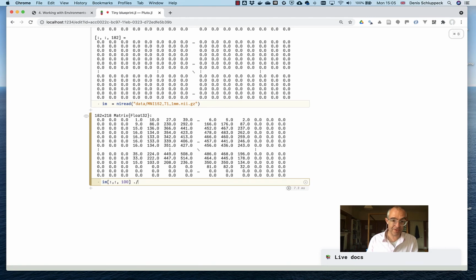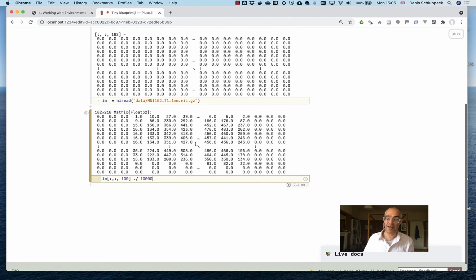The first thing I'm going to do is divide all of the numbers that come in by 10,000, because I have looked at these images before and I know that the darkest parts of the image are labeled with zeros, and the brightest parts, which usually end up being displayed as white, go up to about 10,000. So if I divide every number in this data set by 10,000, the range of values shrinks down between 0 and 1, which makes it easier for this next step, the library, to actually display the images.